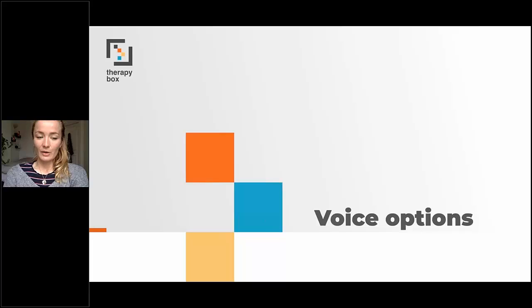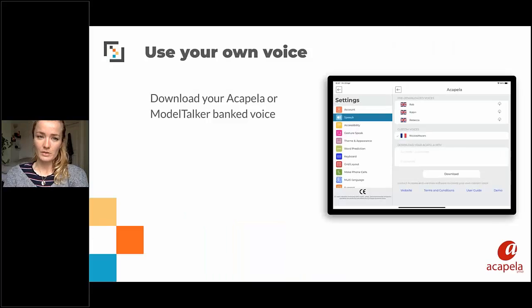Predictable offers different voice options. So with Predictable, you have the ability to download your own voice. If you created a digital version of your own voice through Acapela or ModelTalker, you have the possibility from the speech settings of Predictable to enter your Acapela or ModelTalker logins and to download your own voice and use it to speak with Predictable.